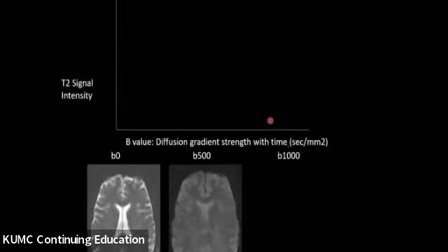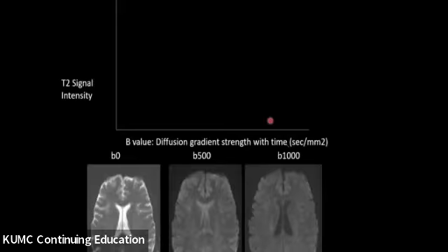Sometimes scanners will send a third data set where the CSF is isointense, and that's called a B500. So think of that as like a midpoint in time, or time 500. But what we're looking for and what we want to interpret, if we're doing it correctly, is the B1000. So that's your dark CSF image. And sometimes scanners will label that as a B1000, sometimes a DWI, sometimes a trace. Different names for different vendors, but that is the one we want to interpret. You can ignore the other images more or less as they are source data.